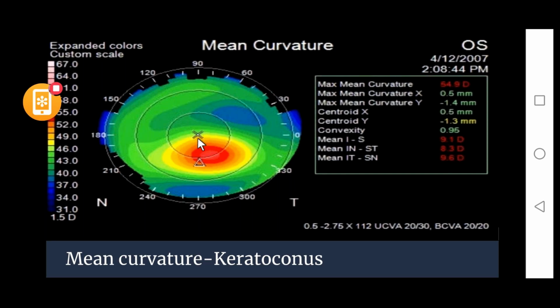That means it is going lower. So on the y it is going lower and a little bit on the right side. So this is the area, this is the position of your apex. This is similar to the coordinates of the maps we see, longitude and latitude. Similarly, the x and y axis, right?